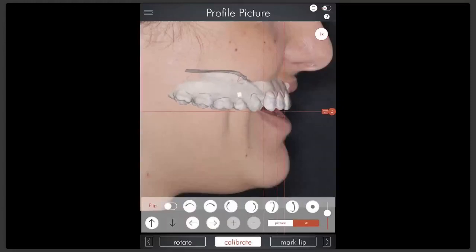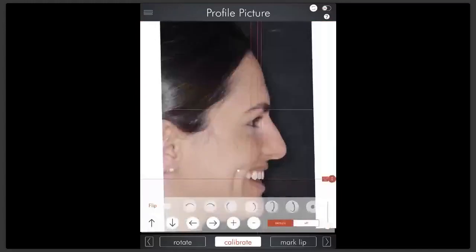The more we see of the patient's back teeth, the better. So in this case, I don't see her premolars, which makes this a little harder. Also, I'm going to change this angulation a little bit. Maybe my photo can be a little bit bigger, right? So I check the cervical. So what I'm going to do is click on the picture, and I'm going to make it a little bigger again.